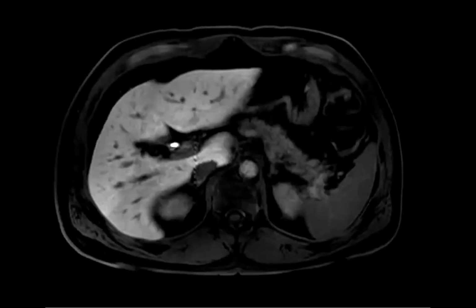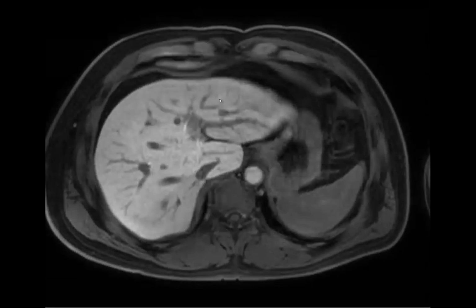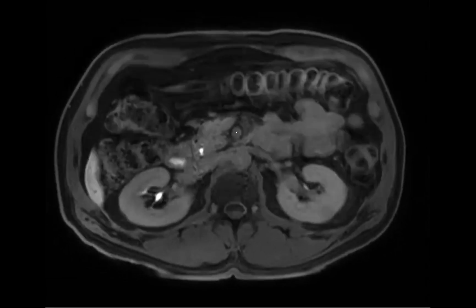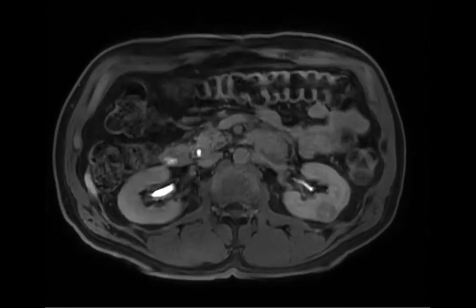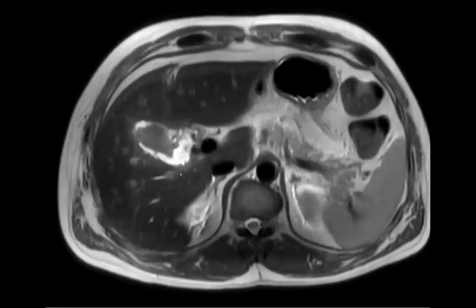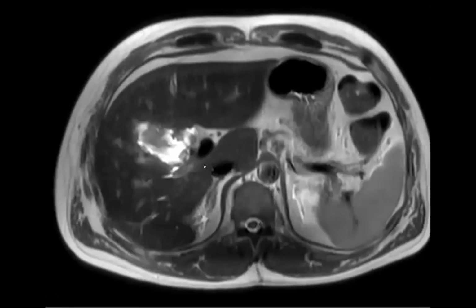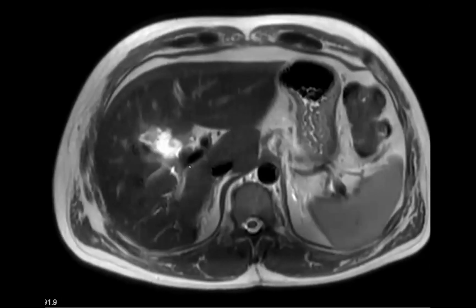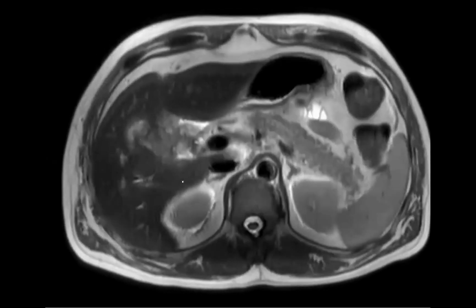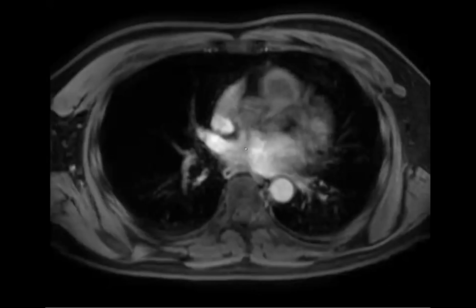Are not opacified. Did they have a recent cholecystectomy? They sure did. And an aberrant right posterior duct that was clipped? Yeah, this was exactly that. This was clipped, and they knew it. They knew this happened. If you go back to the MR, this MR was shortly after surgery. It was a difficult cholecystectomy, and you can see that the duct was slightly dilated then, but it's more dilated now, and I don't think this was done with Eovist. Oh, no, it was.